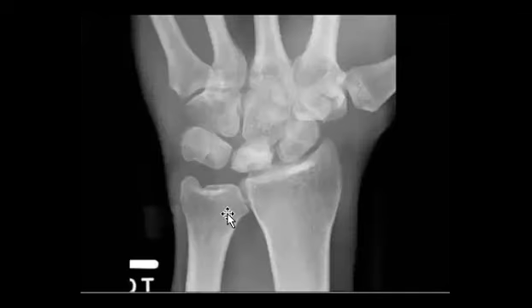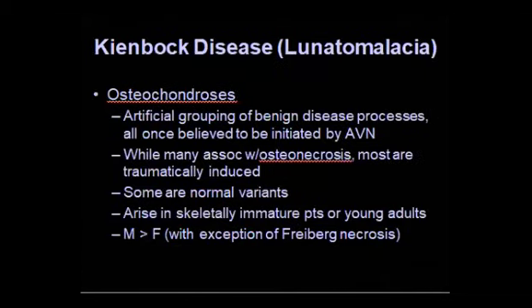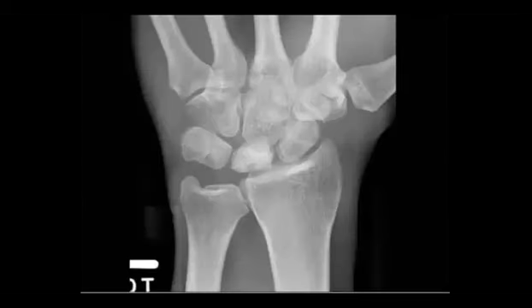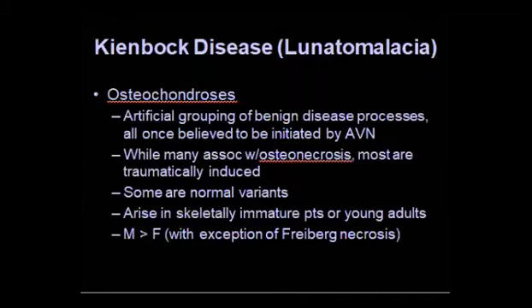This one is in many cases. It's very easy for you, for our stars, which is the Kienbock, yeah. Kienbock disease, which is a type of osteochondrosis, as Blount in the leg or the tibia, and in the lunate Kienbock. Okay. So young child.